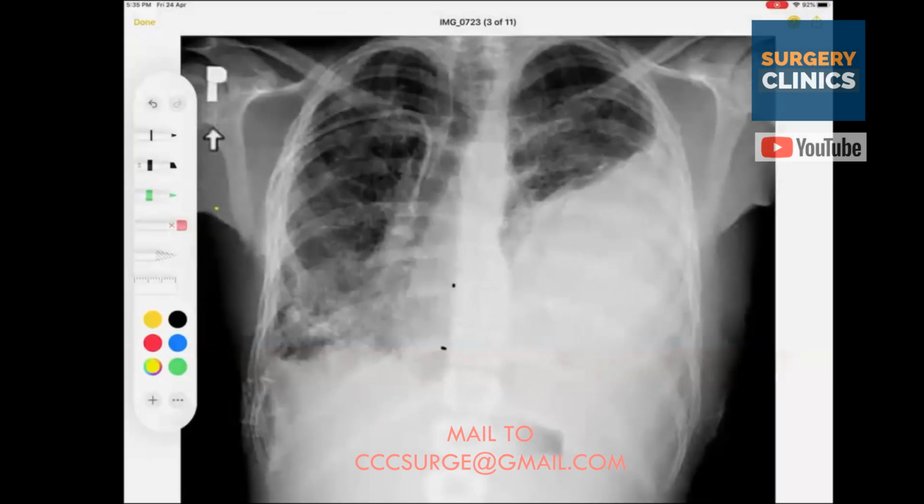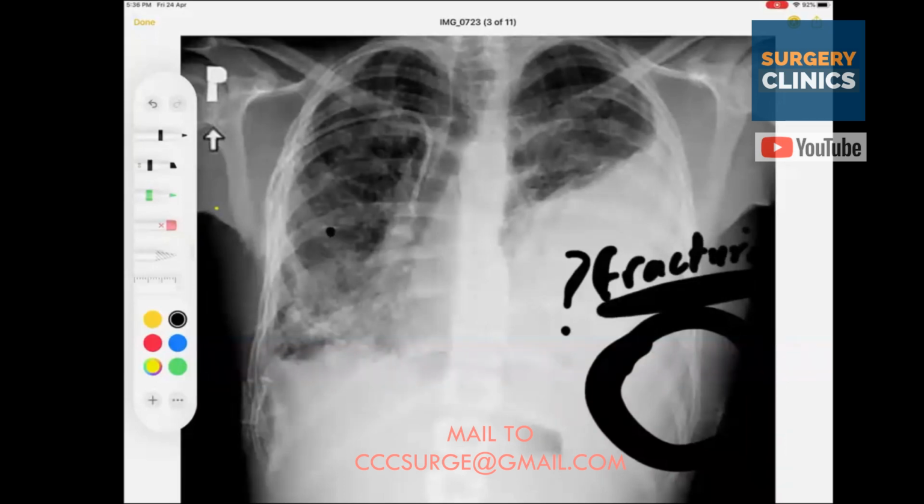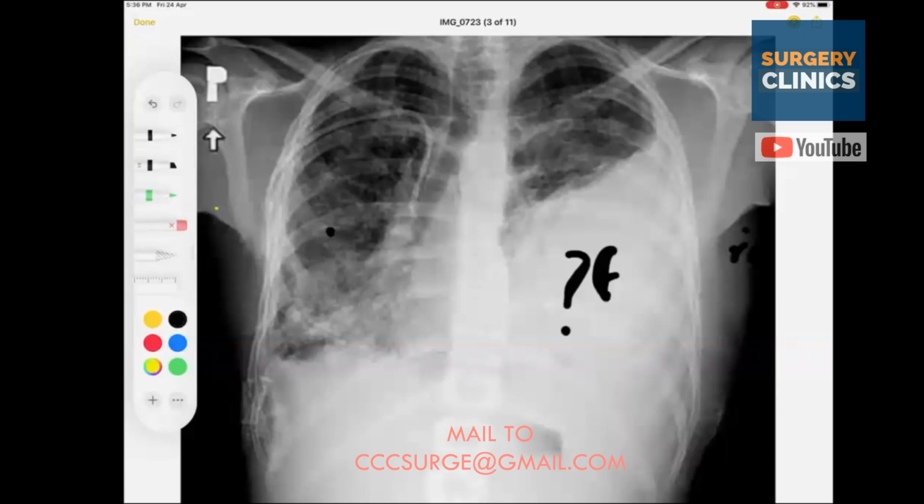Well, not a good quality X-ray, sir, but I cannot understand. Are the bones intact? I am really confused, because for knowing bones, I need to see the upper border, lower border. I'm not very sure whether the bones are intact, but what I can think over is that maybe, a big maybe, there is a fracture. I'm not very sure. I need another X-ray, maybe a better one. But definitely the pathology is on that side.